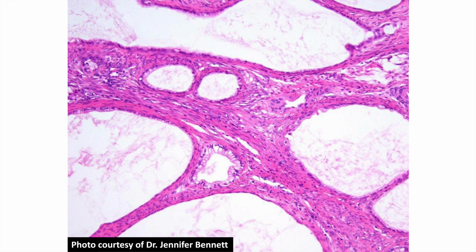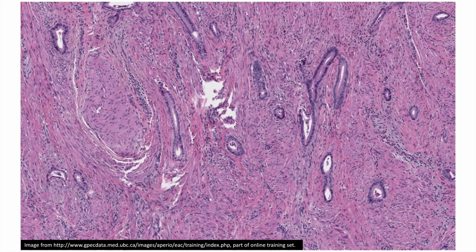Some cases show low-grade cytomorphologic features reminiscent of the in situ lesion we just discussed. The cells have columnar to cuboidal appearance with distinct cell borders, and mitotic figures are rare. Desmoplasia is not prominent. Other cases show more haphazard infiltrative glands. Note the distinct morphologic difference with the usual type, HPV-associated endocervical adenocarcinomas.